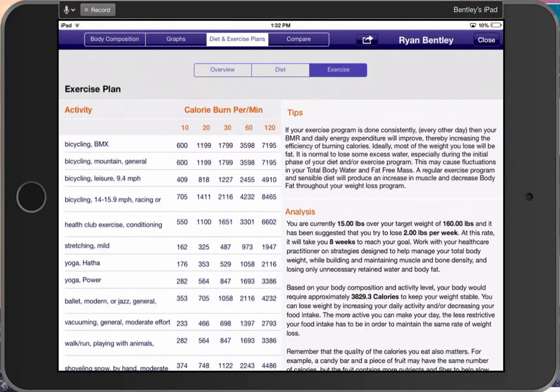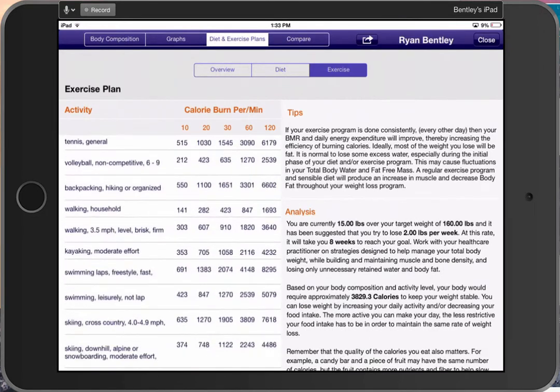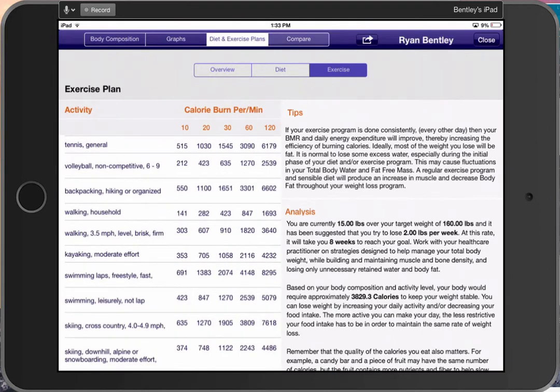And again, you do this and you customize this in settings. Otherwise, it won't print it off if you don't have it turned on for exercises. So it can give your patients ideas of, okay, I need to add or burn an extra 500 calories. Well, I can simply do yoga, hatha yoga, at 529 calories for 30 minutes. Anyways, you get the idea here. So this just kind of gives a print off so your patients have some extra information.